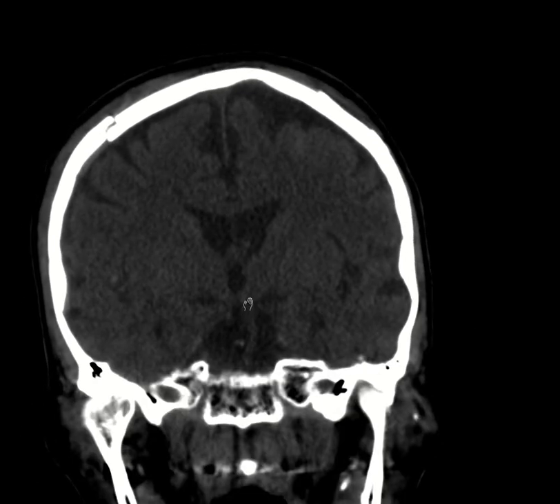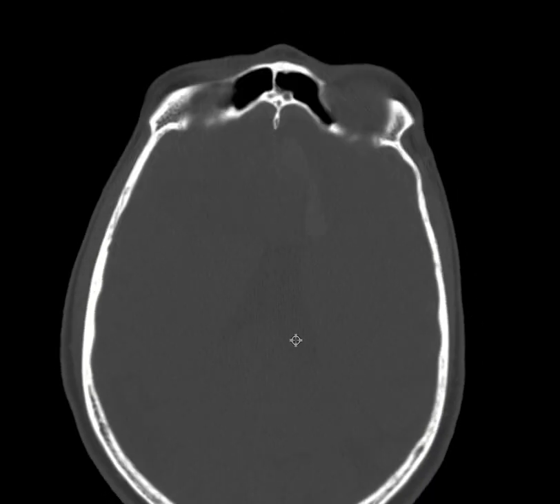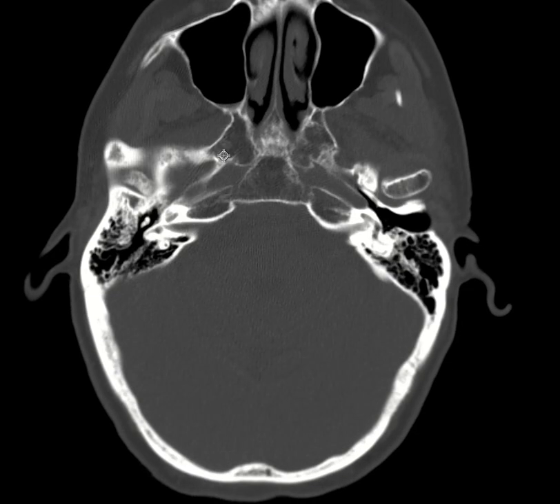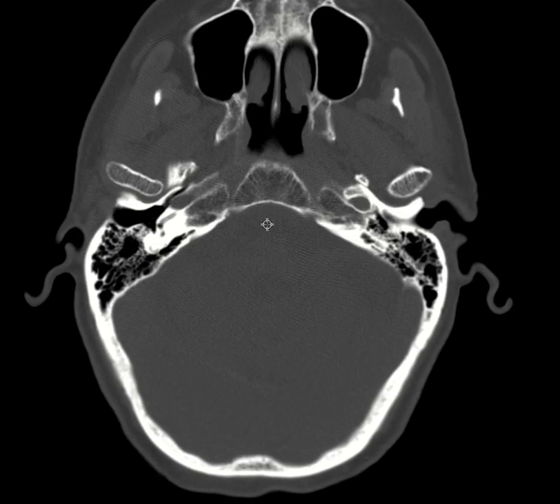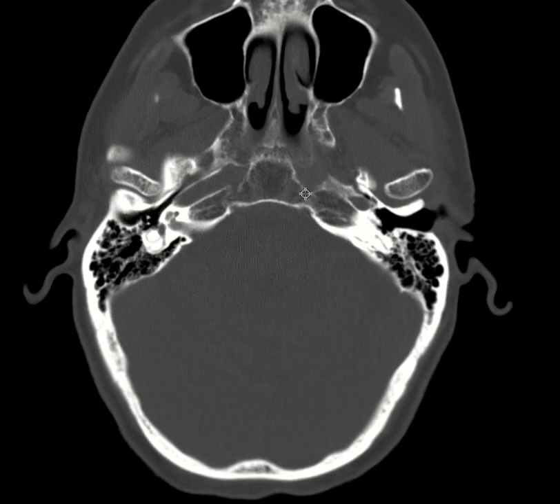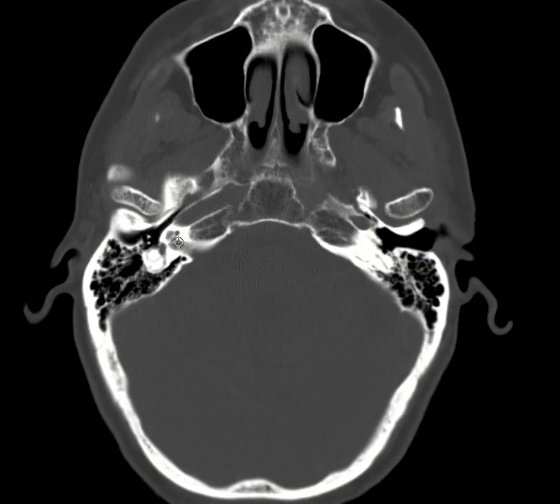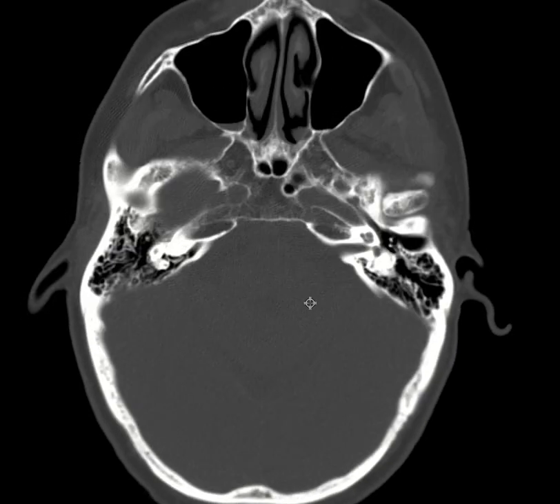And when you look at your actual sequence, if any of these fracture lines go into important vascular structures, like if you have a skull base fracture that goes to the carotid canal, or even the jugular bulb, specifically the carotid canal is very important because we might have arterial injury. And if it goes into the jugular bulb, then we need to recommend a CTA or CTV based on the structure that is involved.